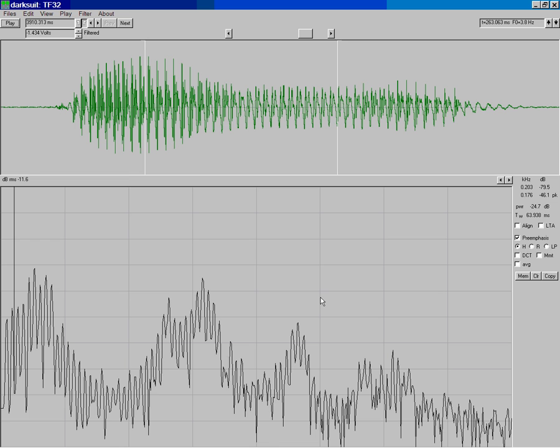As a result, we may be more interested not so much in what's happening at a single moment in time, but in what is happening over the course of an entire longer period of, for example, speech segments. The long-term average spectrum allows us to view where the prominent energy is over a fairly large time domain.